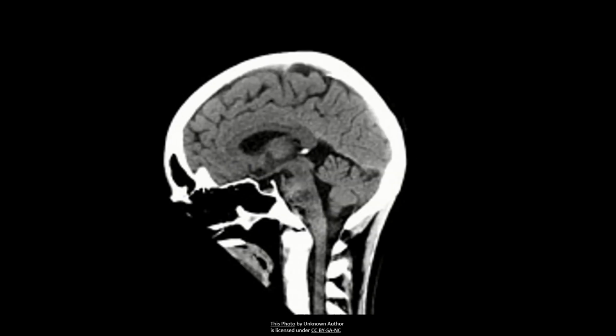Okay, so moving on to the corpus callosum. Firstly, let me apologize for the bad resolution because this is the only usable image I could find without being chased by the copyright monster. Right, so the corpus callosum is this beautiful dome-like structure over here. It's easily my most favorite structure in the brain. The anterior end is the genu and the posterior end is the splenium. The corpus callosum is important in that it is the only connection between the left and right hemispheres. So this is important in the setting of either a glioma or a metastatic tumor to the brain.